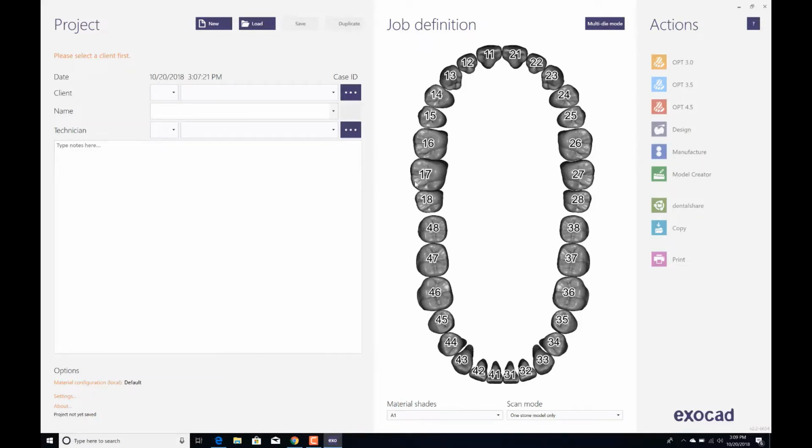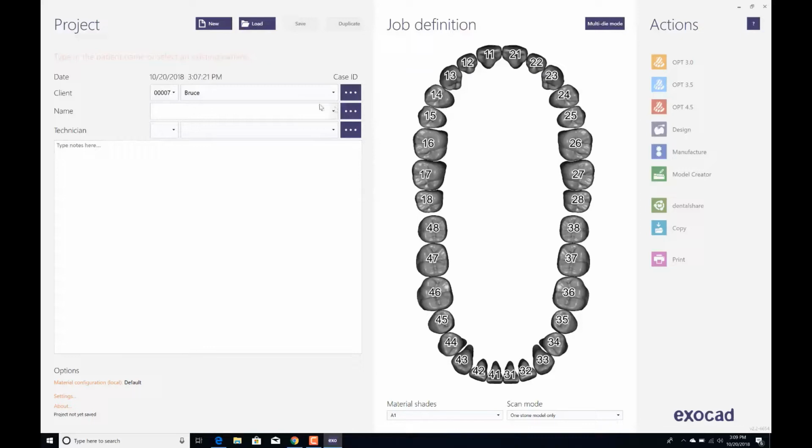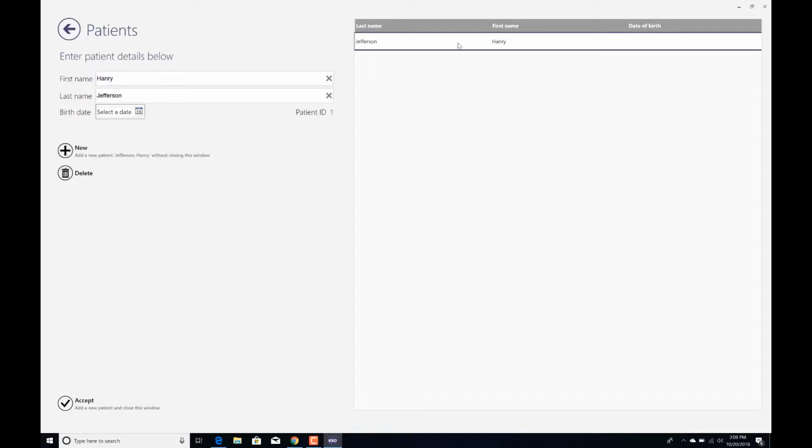So with that said, I will just start creating this new project. I'm going to create a new customer, whose name is Bruce. All right, it's just an example. Again guys, I don't want to fill in all of this. Street, city, you can do by yourself. And then the name of the patient could be, let's say, Henry, last name Jefferson. Okay, click new, it's right up here, and then I'm going to set.